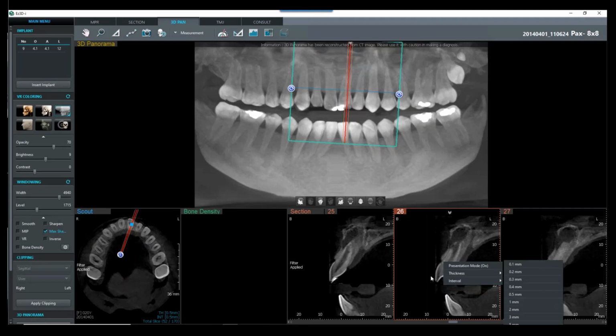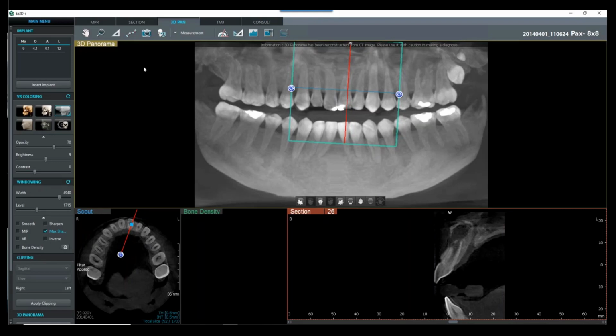There. So from there, we can just simply measure. We can see the abnormality right there in that slice. So we're going to measure and put our implant in. So we click on our measuring tool on the toolbar on top, and then we'll measure from the ridge to the tip there, and we can do the same labial to palatal area as well.